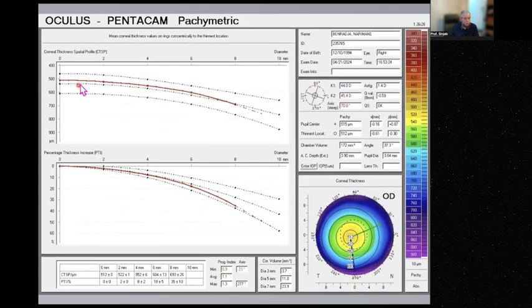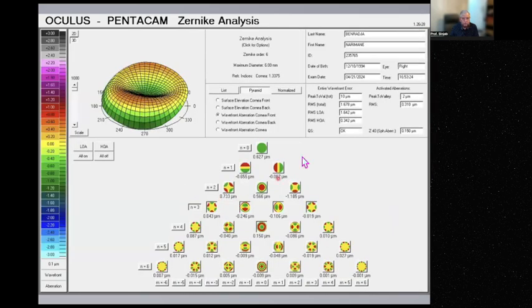This one alone, you see, until 6, then it goes down, but this is not a problem. Average is 1.1. RMS, you see, this is a mistake. Here it is cornea front. It should be this one, wave front aberration cornea, and we look at the RMS.